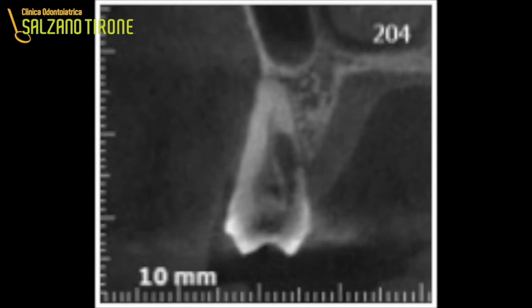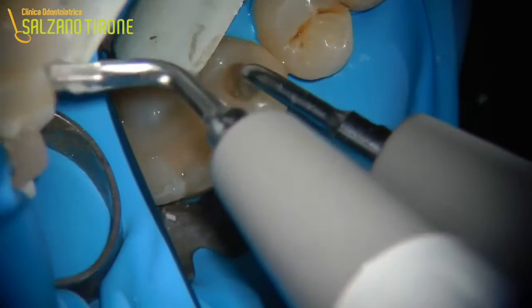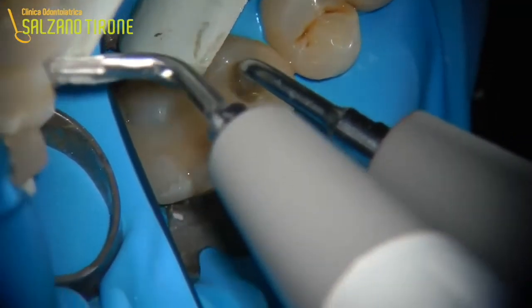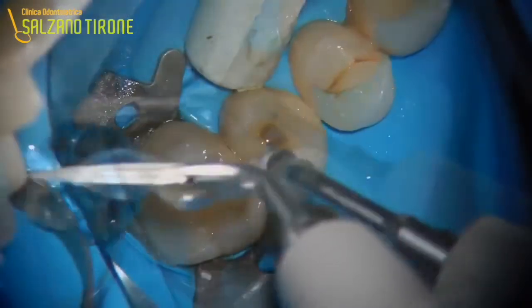In the frontal section we can identify a perforation towards the palate at the middle third of the root, and in the transaxial section we can see well the two perforations we should expect when we get 3-4 mm under the bone. Once we locate the defect, all the practical clinical approach becomes easy because in the end it all starts by an ordinary devitalization.